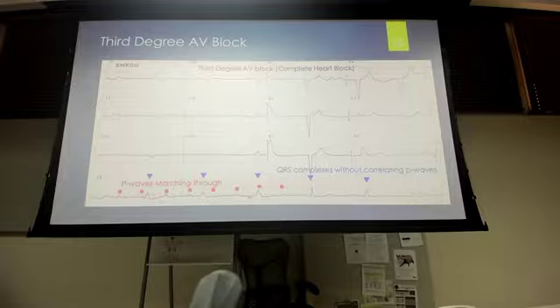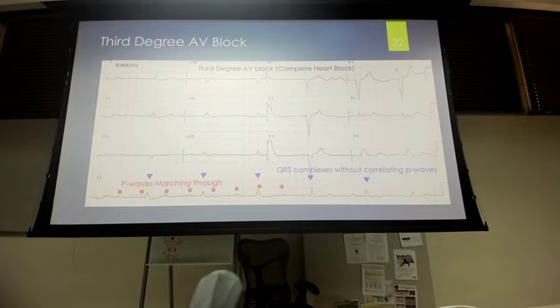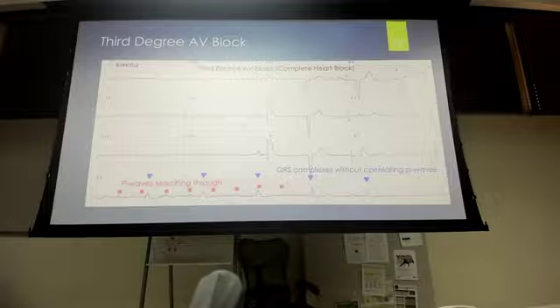If you measure these out, from QRS to QRS, they're just way far away from each other, but they measure out evenly, knowing that the ventricles are spontaneously depolarizing on their own. Does that make a tiny bit of sense? For you, because you know EKGs, but maybe not necessarily for others.